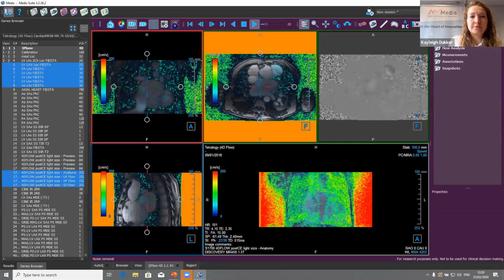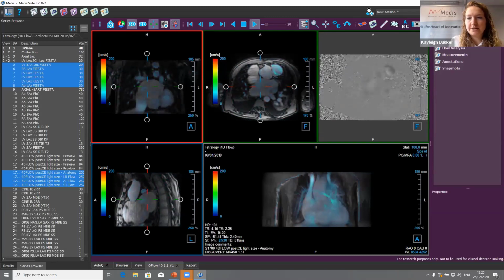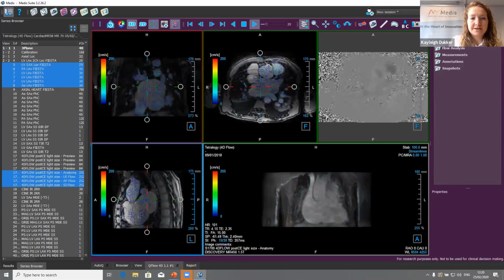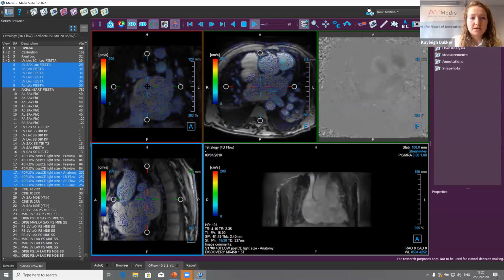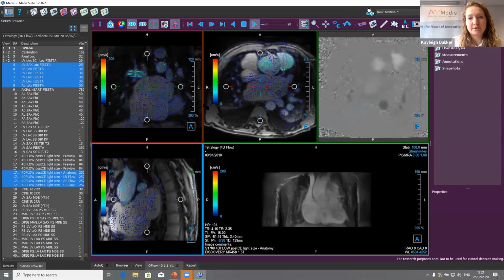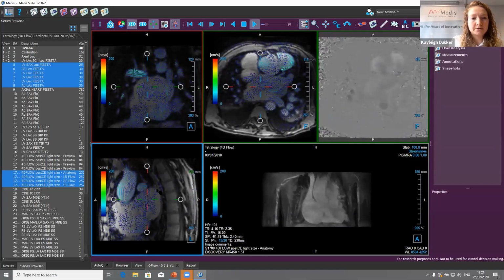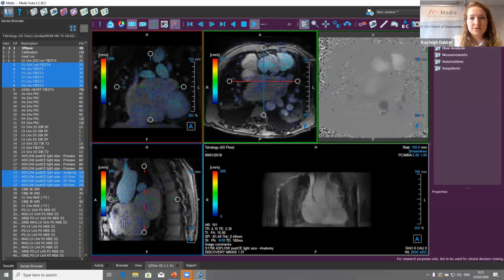So in here as well, I will get rid of the noise, and I will put on the streamlines. I think we lost Kaylee for a moment. Yes, so I just switched back from the speed to the streamlines. I zoomed a bit in. It's taking a while to process for each time point, and then you will see all the streamlines in here.